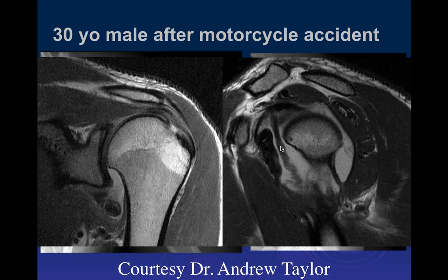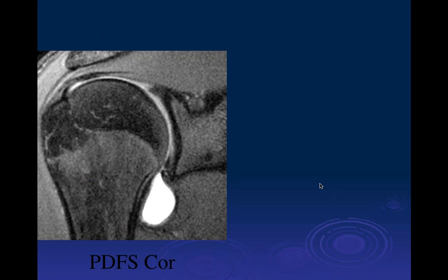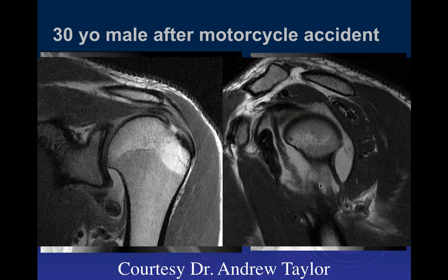What is this? The low signal intensity band that's undulating could be a superior insertion of the inferior glenohumeral ligament anterior band. And that looks undulating, so it's probably torn at its inferior attachment. Was that the low signal intensity on the coronal image? And this is actually a part of the displaced tear of the anterior band of the inferior glenohumeral ligament.